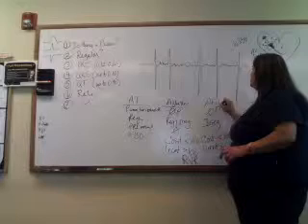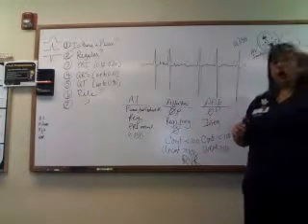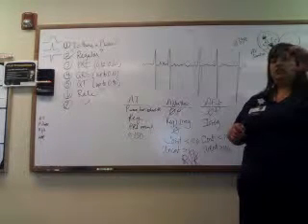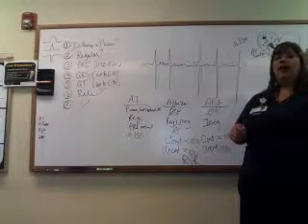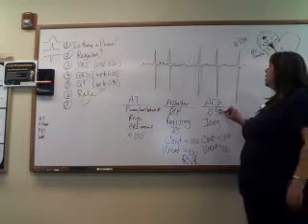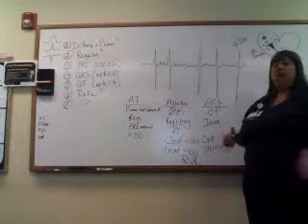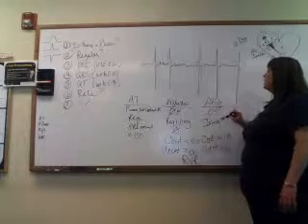This is your atrial fibrillation. What's really happening is the points in the heart are just quivering. All of these points are firing, it's quivering, it's fibrillating. And then the guy in the safety net will have it fire every now and then, just so that we get the blood pumping around the body. If this is somebody that's a new onset atrial fib, they won't feel very well at all. Some people that are chronic, they feel like this and they do fine with it. So this one is atrial fibrillation.